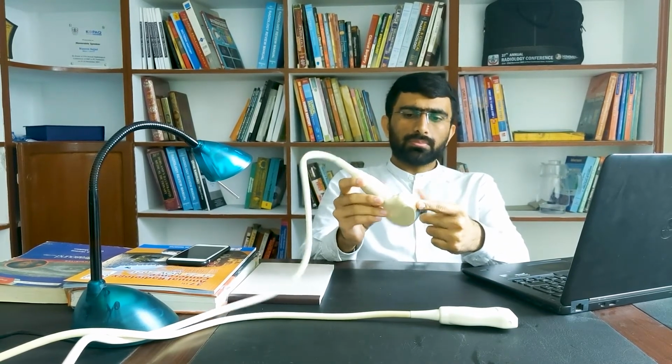Before you start doing ultrasound, it is very important first to identify the pointing end of the probe. So always identify it with the help of a pointer, a mark, or a light, or in this probe there is a line which indicates that this end is the pointing end. You can see there is no mark on this side, but there is a line or mark on this end, so this end is the pointing end.